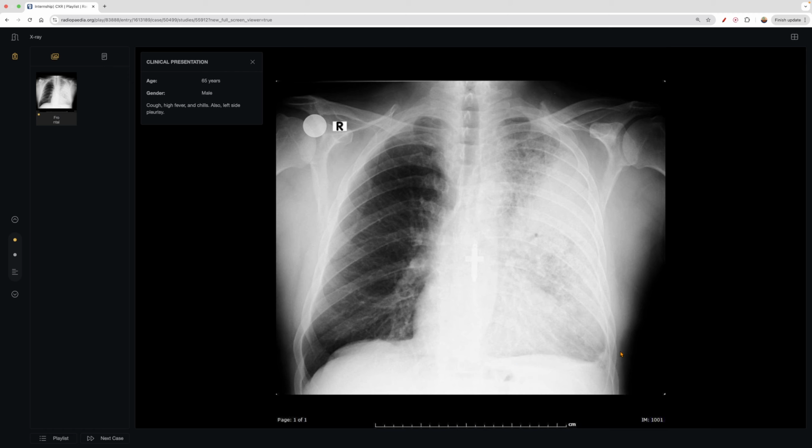We see it's also rounded, so there's some kind of effusion, but because we can see the diaphragm, we know that if it were a left lower lobe pneumonia, maybe it's a bit more superior, but it's at the very least a left upper lobe pneumonia, right? We don't see the heart at all. Not heartless, full of love, but otherwise hard to see.